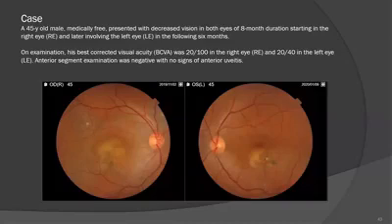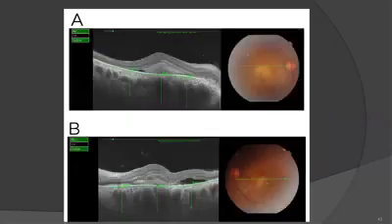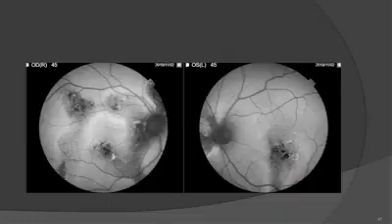And just to explain to the audience, some may ask why the choroid was thick in this case and why we should not suspect posterior uveitis. This is correct, because in chronic CSR the choroid is thick. It's one of the pachychoroid diseases. That's why sometimes the differential diagnosis is not easy, and that's why we need multimodal imaging to be very helpful for us. In this case, fundus autofluorescence was a non-invasive, very useful tool to reach the diagnosis.